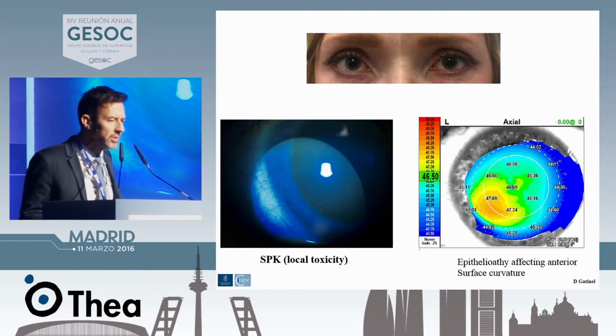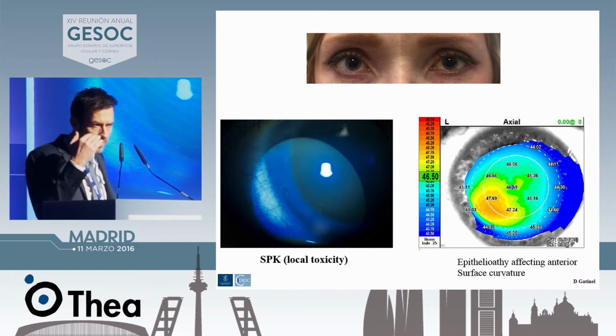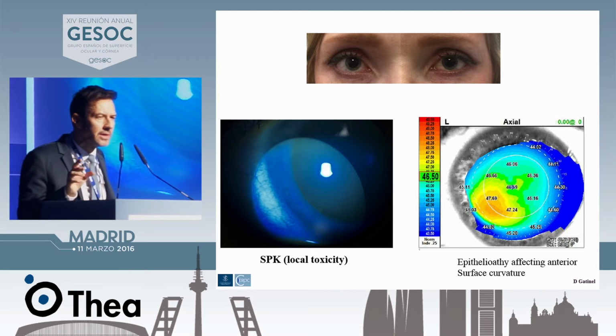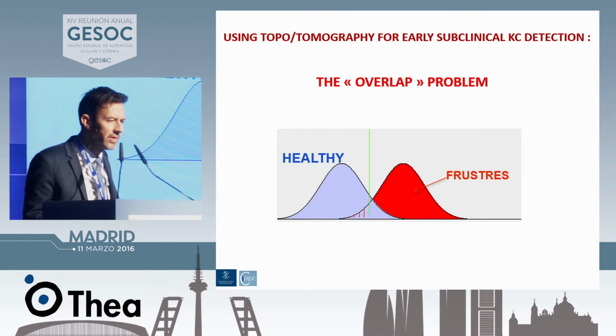I would do probably LASIK, but if I wouldn't do LASIK, it's not because of ectasia, it's because of ocular surface, because here, placido is sensitive to some SPK, which is due to some eyeliner that the patient would use daily, which would cause surface irregularities and SPK. And this SPK is explaining the kind of artifact curvature steepening there. But this is not keratoconus here again. And you know it because of elevation.